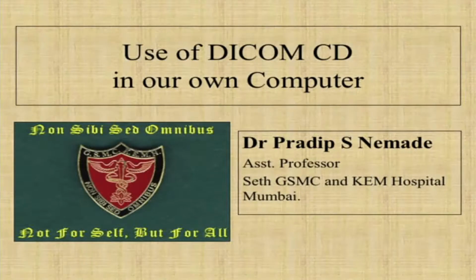So this software, the 3D Slicer and all the softwares that are shown, they are very complicated softwares, and Horos is kind of a light version, you can say. It's a handy tool. Whenever your patient gives you a CD of the CT scan and you want immediate information, that can be obtained with this. It's basically a DICOM viewer, but with a little more processing capacity.